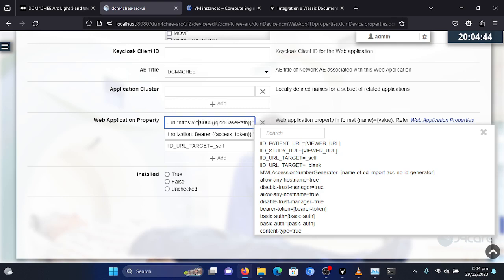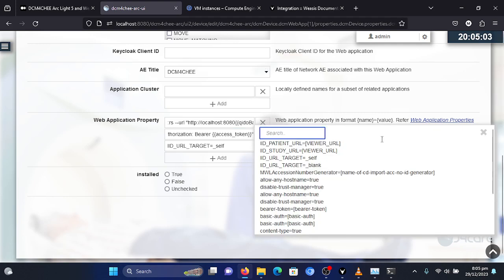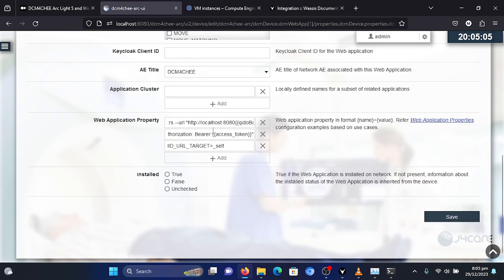I don't have one, so I'll be using the non-SSL HTTP request, which is not recommended for a production setup, but for this case, since this is just testing, this is great. This will work for us.